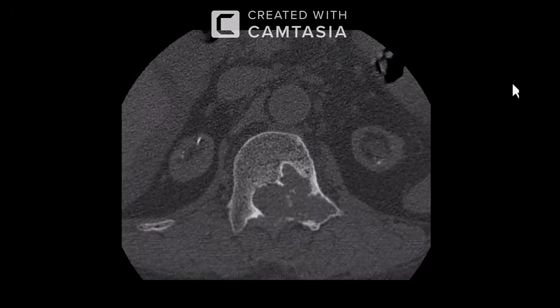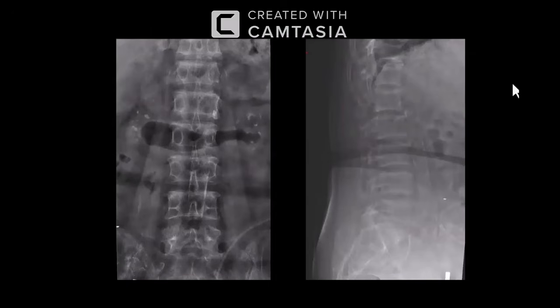Okay. So, you mentioned myeloma, metastasis, and lymphoma. Probably myeloma, do you think it'll involve only a single bone? So be cautious in the exam. Don't put myeloma as your first differential, especially in these cases. And probably to some extent, I can agree with lymphoma and metastasis.